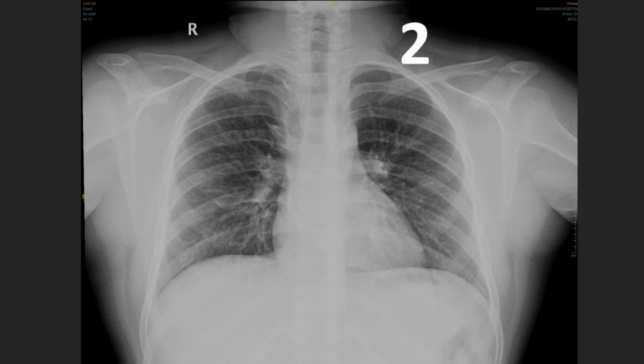I think slightly underexposure, but still you can see it very well. What's the diagnosis? Yeah, I'm giving the arrow. Now you know the diagnosis. This is very common in the exam, not only for radiologists, but also for other specialties. That can be mistaken for something else. That's very important, especially in a case of tuberculosis or a tumor. So you have to know about this.